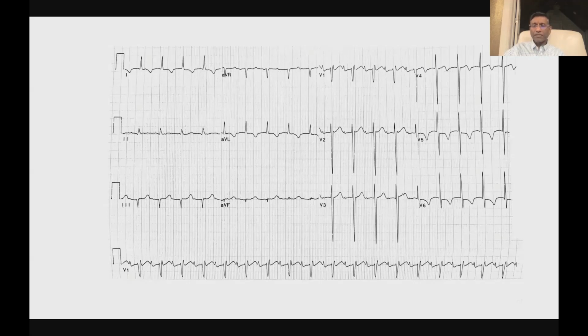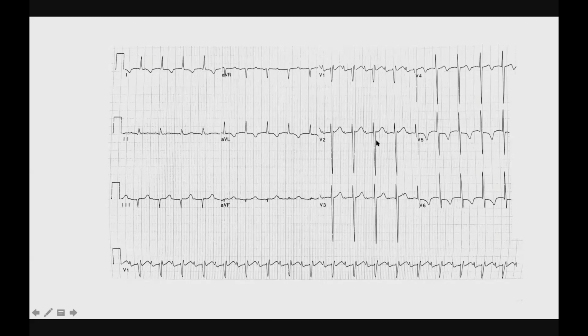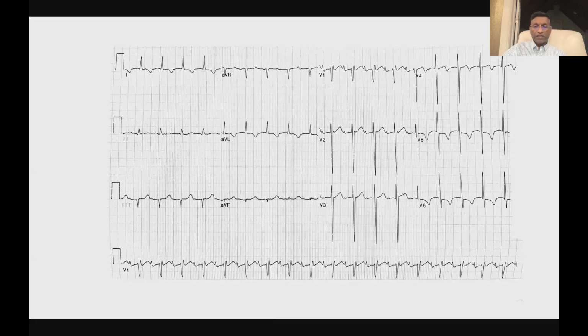Remember, the right ventricle is anterior and the left ventricle is posterior and leftward. So you have voltage going away from leads V1 and V2 and towards V5, V6, 1 and AVL. I do believe it is ventricular hypertrophy there, because you have the criteria met here with deep voltage as well as opposite direction STT wave changes, what we call secondary STT wave changes.